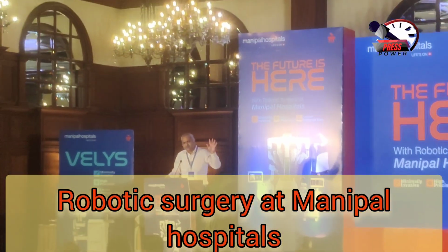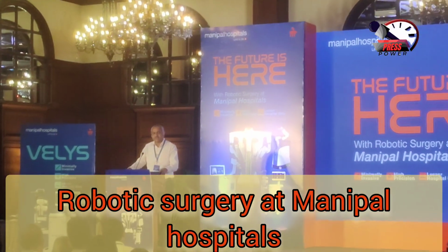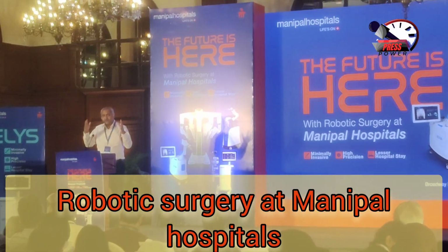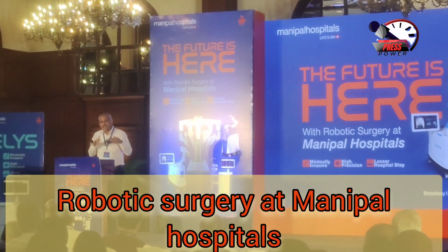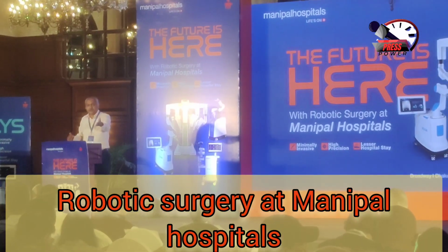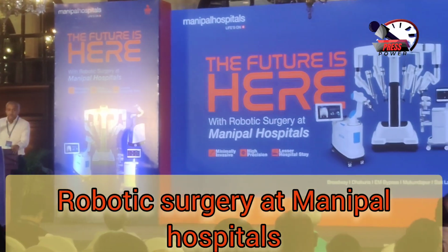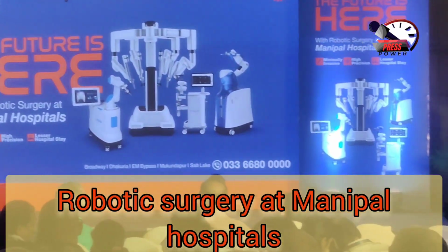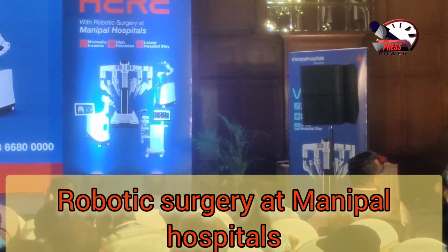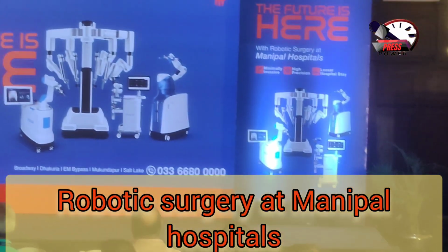If I enumerate them, first of all, the biggest advantage is our hands' movement. Our hands are big enough and cannot reach every part of our body easily. Like I can see Dr. Arunavo, Dr. Arunansu, Dr. Abhay are there. They work in the pelvic region, that is the lower part of our abdomen.